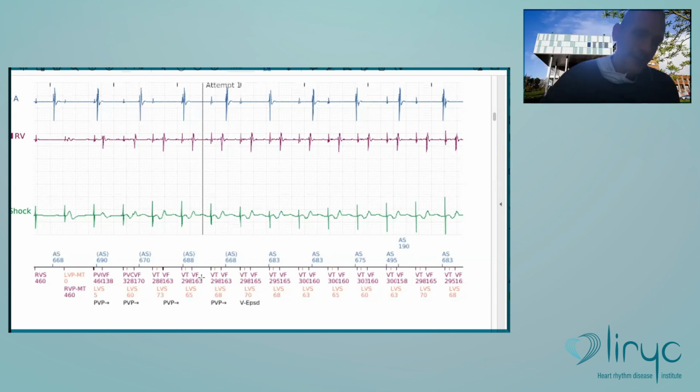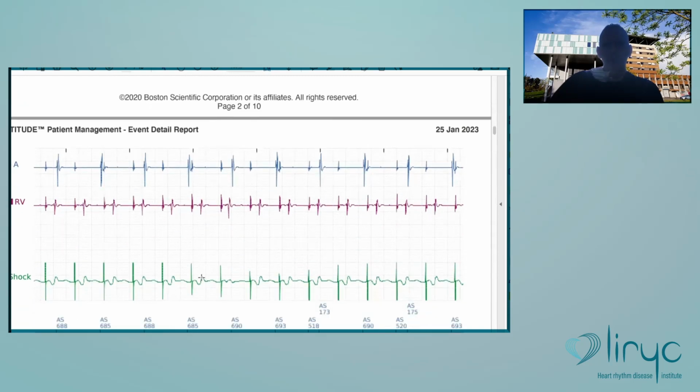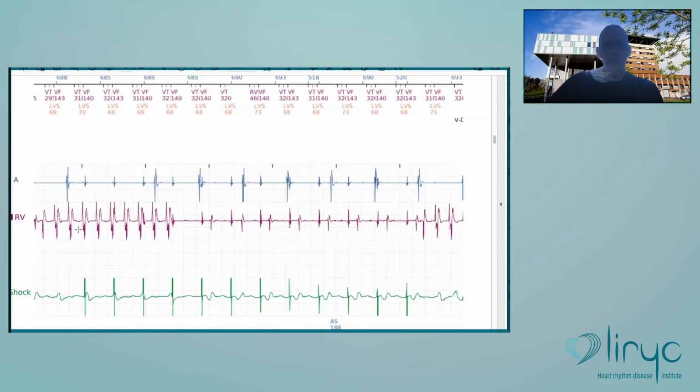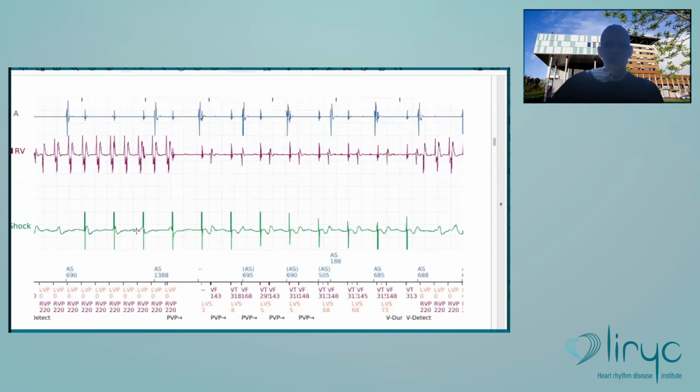First of all, if you implant a TAVI in a patient with a defibrillator, you should also, in the same way, deprogram monitor and therapy. In this patient, I'm a bit surprised that the physician has not seen this, because after a certain time, at the end of the initial duration for the VT zone, an ATP is delivered.